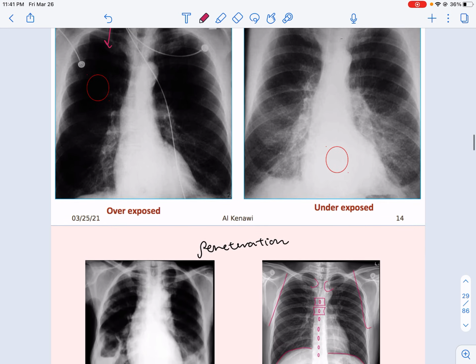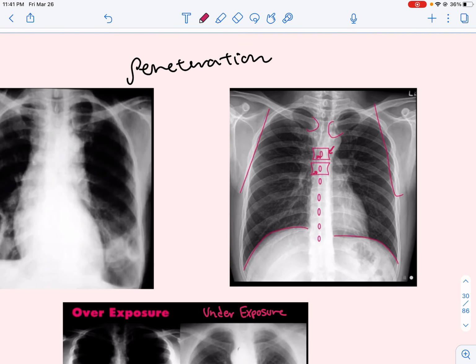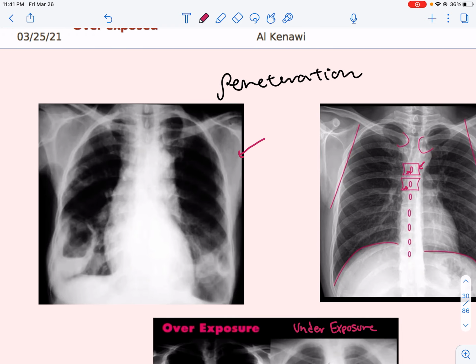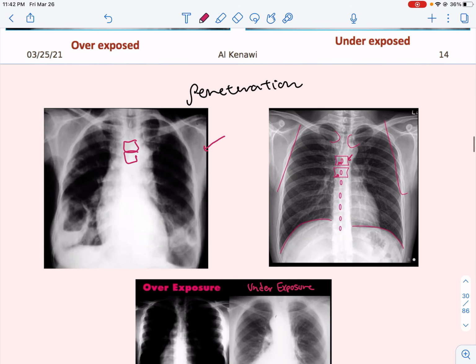هذه يسموها exposure. في penetration it's important to assess like can we see the spinous process, can we see the vertebrae, can we see like all of this structure. It's important to see the diaphragm, all of that. مثلا هذه الصورة we cannot see actually, like I cannot see the vertebrae here, so here assessment of the quality, this is not a good picture to even like say a diagnosis from it, because the penetration is not that good.